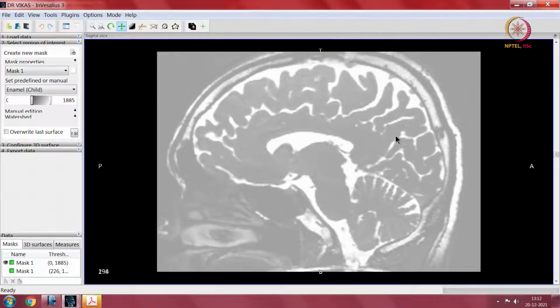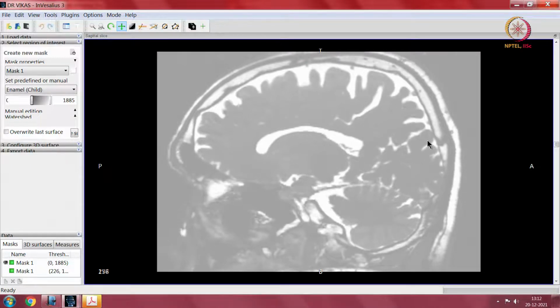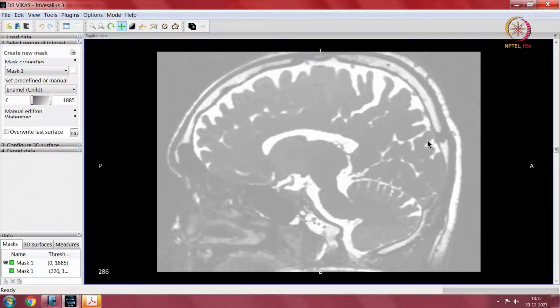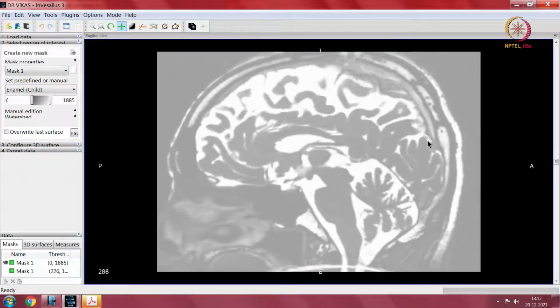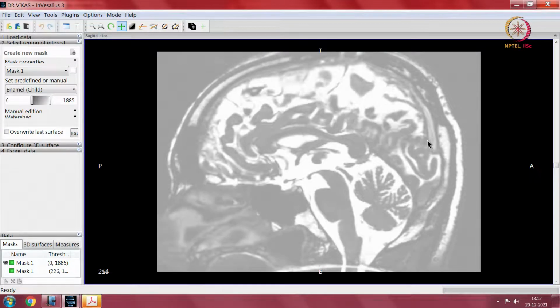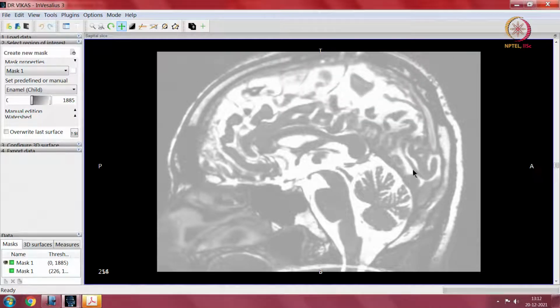There is another sulcus which is seen only in here. The calcarine sulcus, which is where the vision is handled, is this one. This is where the primary cortical vision gets processed, and then goes to several associatory areas in other parts of the brain, but this is called the visual cortex.